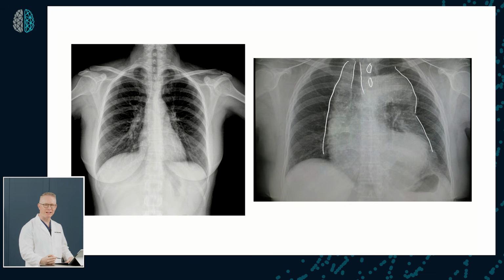That patient's not aligned midline. The other thing is the left clavicular head is here. The other one is over here. So you can see that the distance there is off. They're not equal or symmetrical.